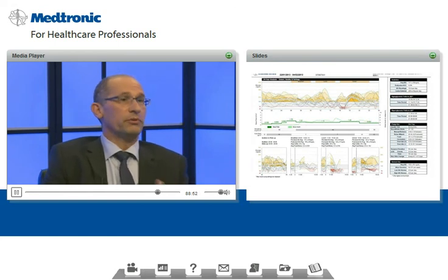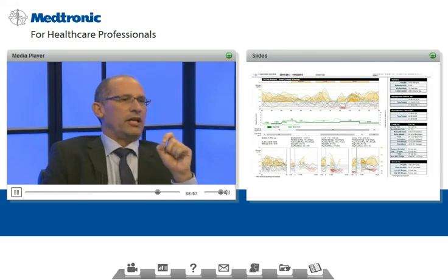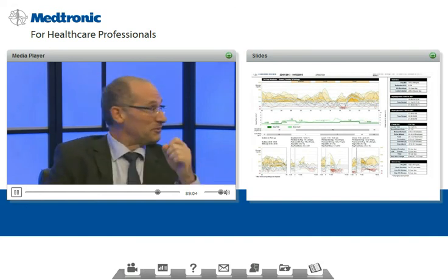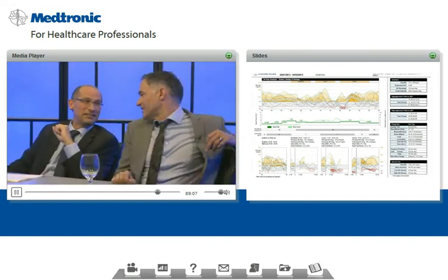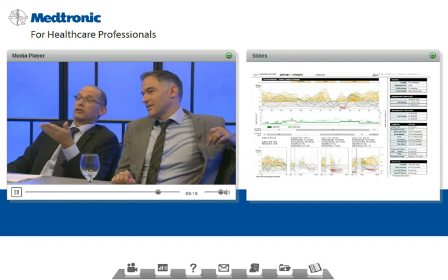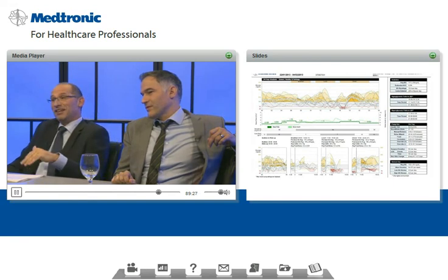Okay, this is a tough question. It's with the last question. Is the issue at hand an insulin to carbohydrate ratio issue? And if we just change it, by the way, should we increase the ratio or decrease the ratio? We didn't get the answer from the crowd. But if you want to decrease the excursion, that means you have the ratio to go down. That means for every, in this case it's 7, in order for the patient to increase the bolus, it has to change to, let's say, 6. But if you want to prevent the post-meal hypoglycemia, you have to do the opposite.